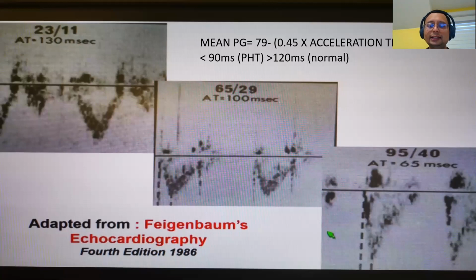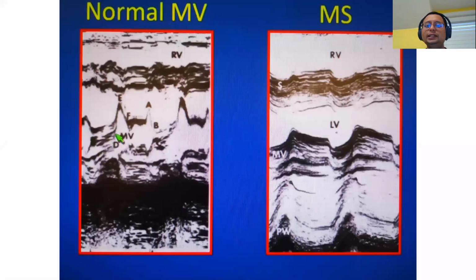So next we go to the next M-mode. This is the M-mode of a patient with mitral stenosis, another favorite in board exams. What do we see here at the beginning? You have to recognize this typical pattern of opening of the mitral valve on M-mode. That is the anterior mitral valve leaflet, going up at early diastole, then down again, then up again at end diastole, and only then does it close.